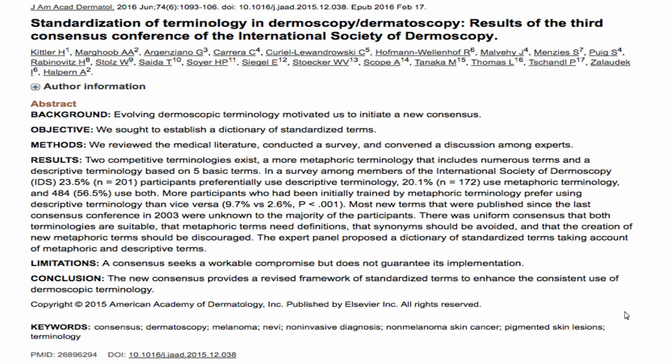So the group compared modified and the conventional pattern analysis and came to the conclusion that the modified one was easier to use, but the conventional one was much more fun. And because of metaphoric terms like starburst or strawberry, it's just like saying an elephant's an elephant. We don't say an elephant has 2 ears, a long trunk, and 4 legs and a tail. We just say it's an elephant. And so in the same way, we can say that's a strawberry pattern.